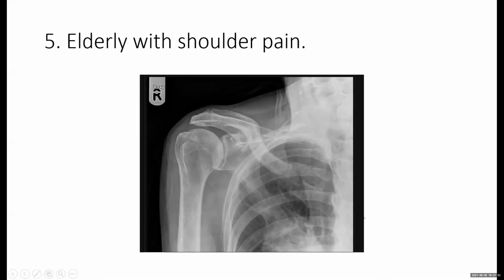Okay, go ahead. This is a frontal chest X-ray of the shoulder. I can see there is an increased density in the right hemithorax, specifically in the perihilar region, extending to the periphery. So it gives me the possibility of chest or lung CA. And I would like to look at the bony cage. I can't see anything unless there is some increased density in the right clavicle, but there are no lytic lesions in the humerus or scapula.